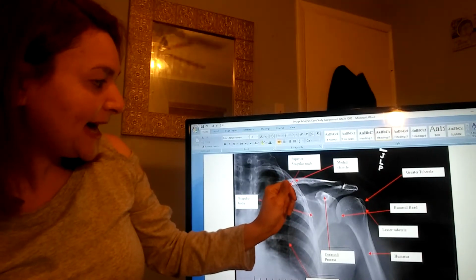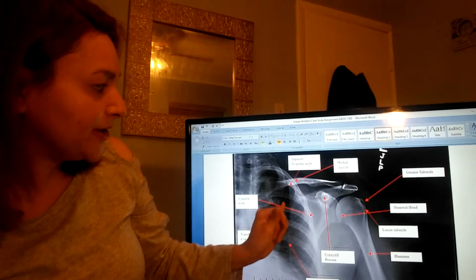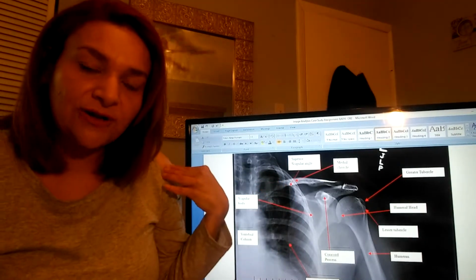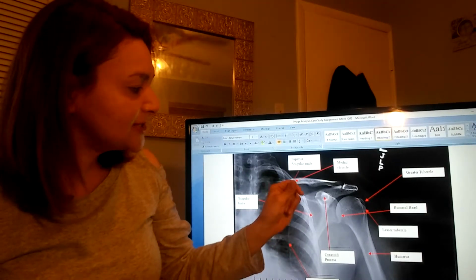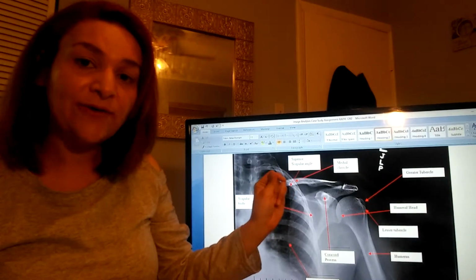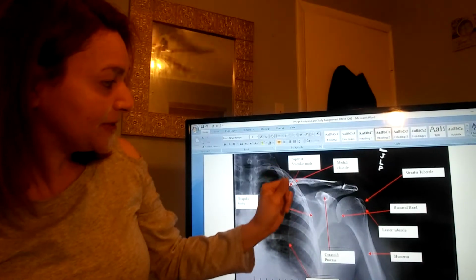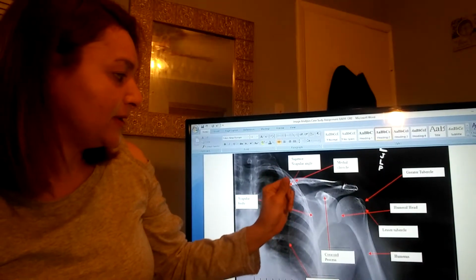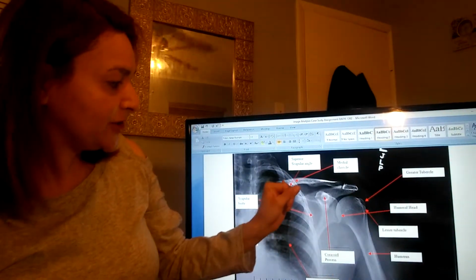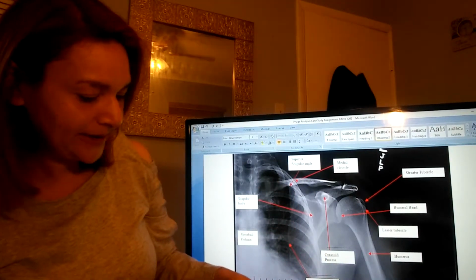Now, if you were to have any tilting, whether forward or backwards, this would move your superior scapular angle. So if their shoulders were hunched forward, that's going to bring their scapula body up, and they would not be superimposing. If you had your shoulders back too far, it would bring the superior scapular angle down. So that would indicate whether there was anterior tilt or posterior tilt, which here you can see they're actually superimposing each other the way that the image criteria needed it to be.